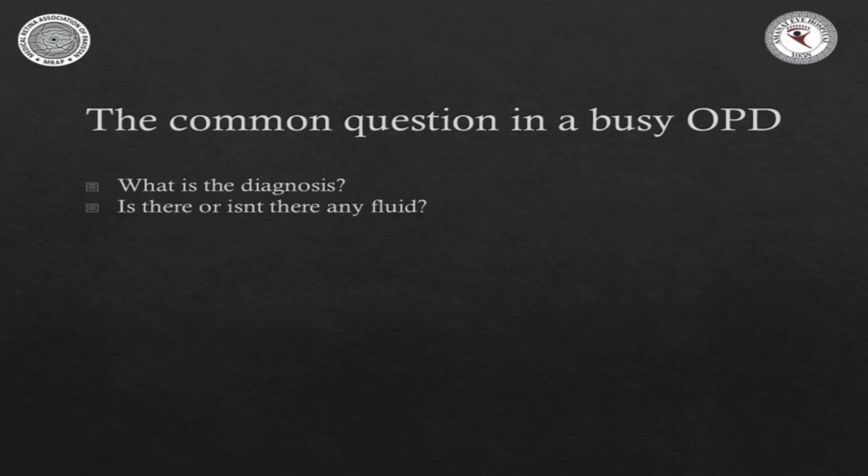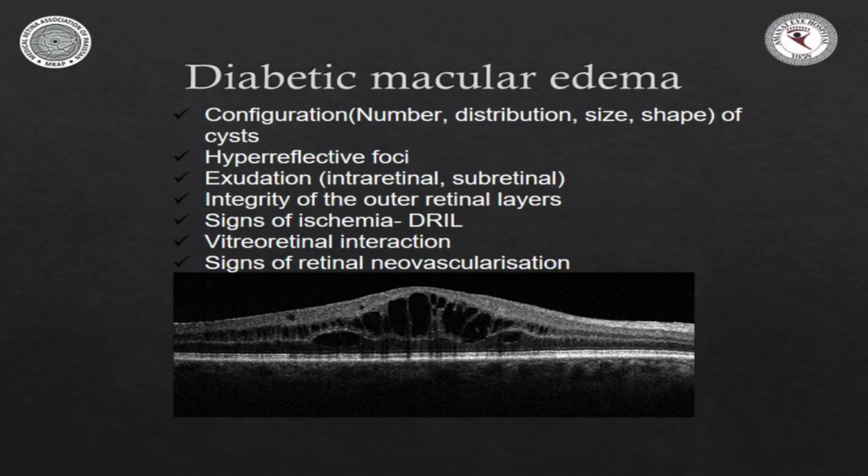So we look at this diagram, this OCT, and we say, okay, so this is diabetic macular edema, CRT बढ़ गई, macular volume बढ़ गया, और इसको injections की ज़रूरत है. But if you look closer, there are so many things to evaluate within the same OCT. Not every diabetic macular edema OCT is the same, and you can get subtle hints and features on the OCT that tell you a lot more about what the patient is going through than just the fact that he's got edema.